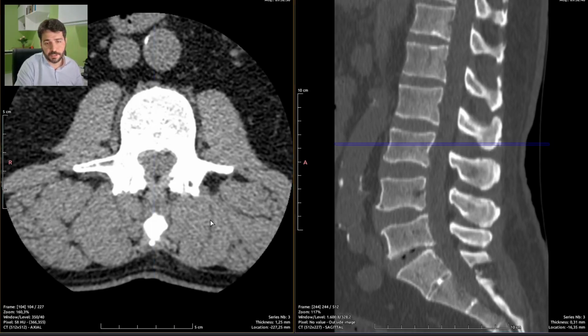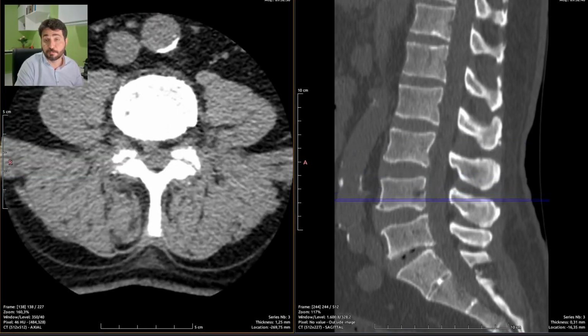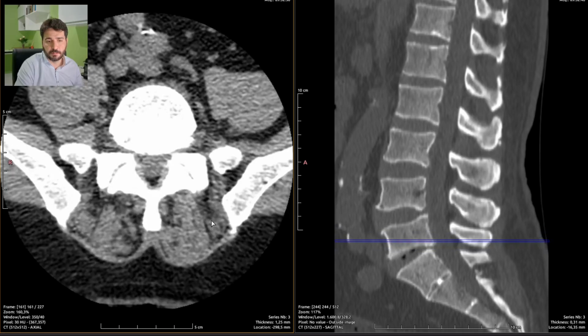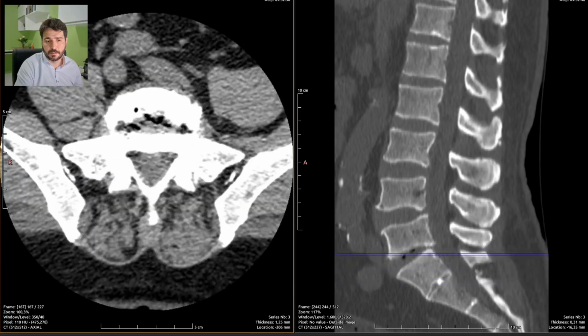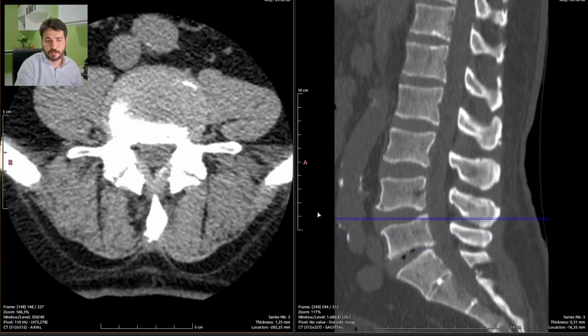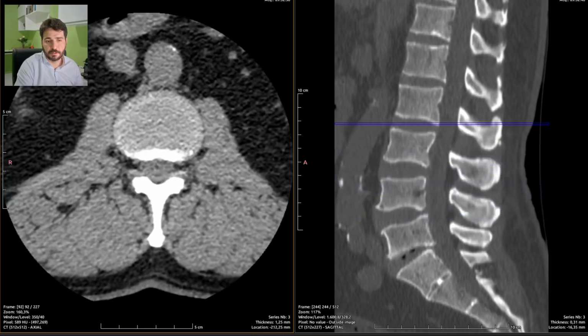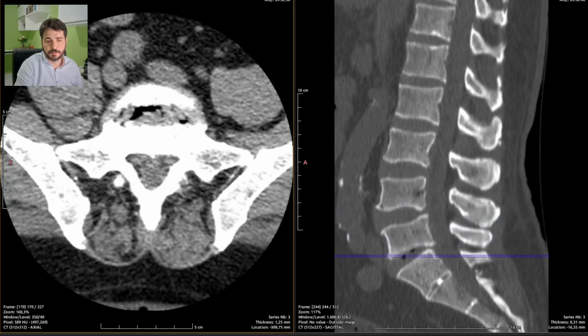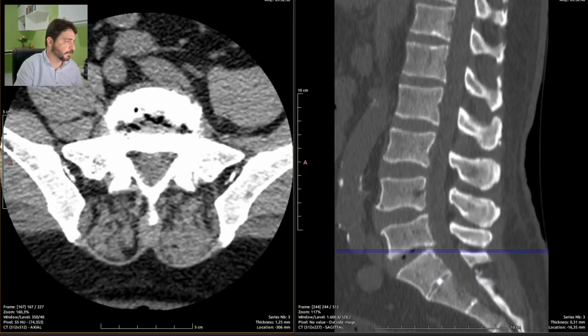And we also have thickening of the ligamentum flavum, which are the yellow ligaments. As you can see here, they are thickened and they kind of bother the dural sac right here. So this is degenerative. This is from overload of the spine and old age, and this contributes to symptoms, so we must report it also. It's already here on my template.